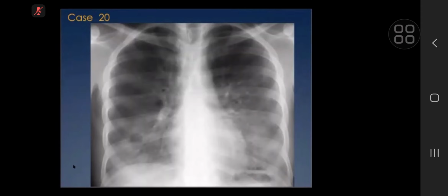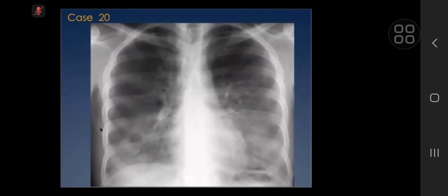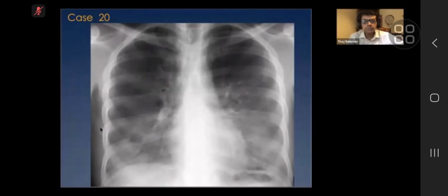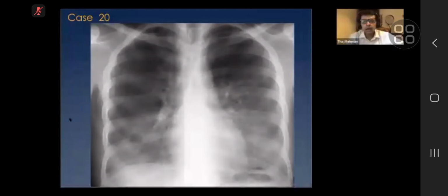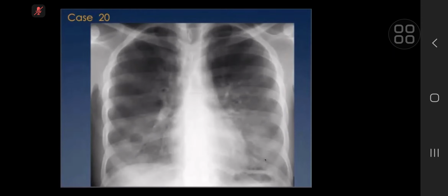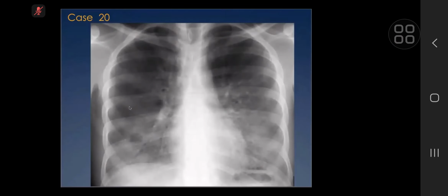Next case. A chest radiograph showing bilateral, I think acinar shadows again, but on the right side there's a cavity. Very good. And the differential is long. These could be septic emboli with cavitation. Will there be background consolidation in septic embolism? Bilateral? Unlikely, very unlikely.